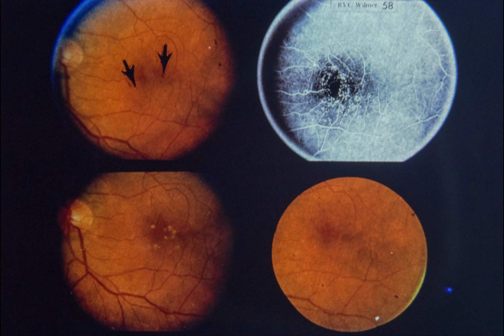Comment. For patients with vascular abnormalities in the macular region, we prefer argon laser photocoagulation because of the slit lamp delivery system and the smaller coagulations that can be delivered. For peripheral telangiectatic vessels, either xenon arc or argon laser photocoagulation treatment may be used effectively, the only consideration being adequacy of treatment. More than one treatment episode may be required regardless of which modality is used.